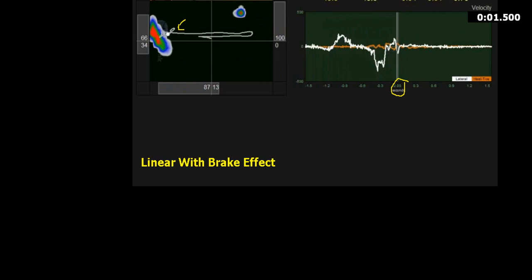So now the power trace is defined as a brake effect. When the brake effect occurs, the white line must be going above the baseline towards impact, so it's going forward to the forward foot prior to impact. That's the power trace. Terry Hashimoto with BodiTrak, 7 traces of golf, and this is just the beginning of it, and I wanted to get it out there fast. Thanks very much, guys.